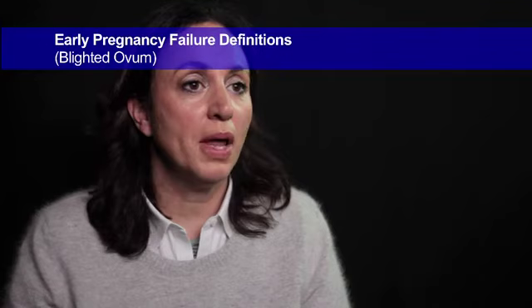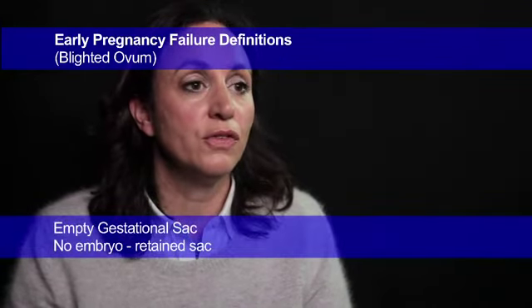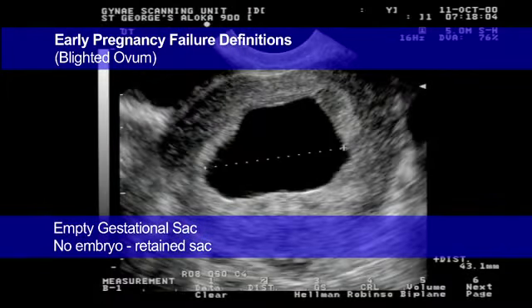The old term blighted ovum refers to the finding of a gestational sac which is empty. There is no embryo. The sac is retained. It has not started to break down and be expelled, but there is no embryo within it.